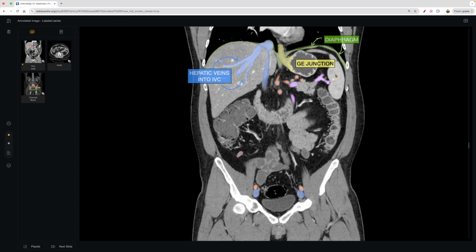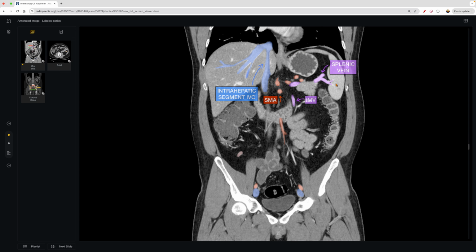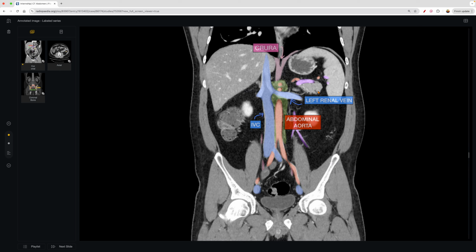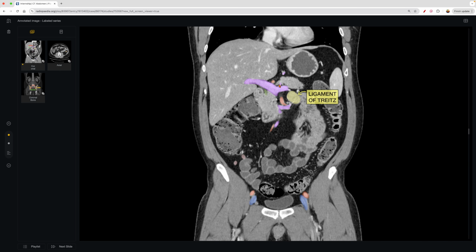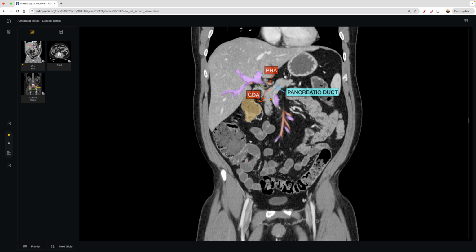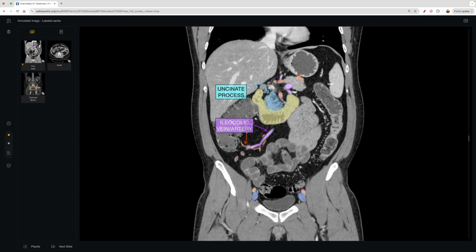And you'll see here the left upper quadrant, we have the spleen and the splenic vasculature coming from the splenic hilum there. And then you'll see the pancreas tail. It's this lumpy appearance here, and it goes all the way from the middle to about right upper quadrant area. And of course, this is the epigastric area that we're seeing the pancreas. And then, so we'll scroll back so we can see the stomach here.